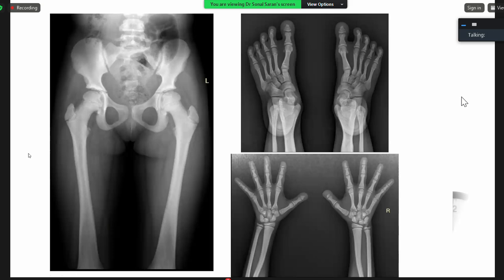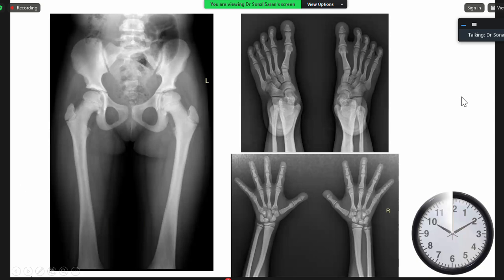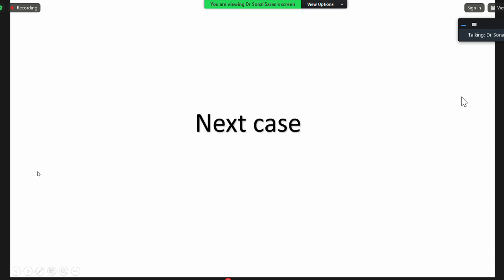What is the diagnosis? So you have osteosclerosis all over in the pelvis and long bones, all right? The small bones, bilateral hands and feet also, you can see osteosclerosis. But there is a peculiar or unique thing over here. We are also having osteolysis in the terminal tufts. That is acroosteolysis. So what does this indicate? This indicates pycnodysostosis. And pycnodysostosis is basically osteosclerosis with acroosteolysis.